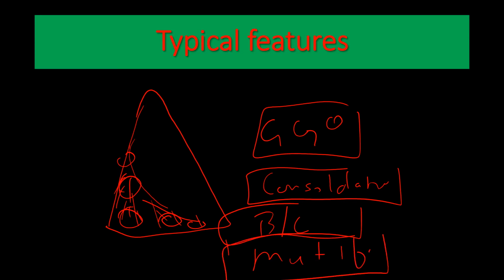But in the recent studies, when they studied multiple images, what they realized is that the involvement of the basal segment was not consistent in all the patients. There are some patients where they were frequently finding the lesions even in the apical segment without any gradient. So that part was removed. The basal predominance was removed from CO-RADS because it is not consistent with a COVID patient.